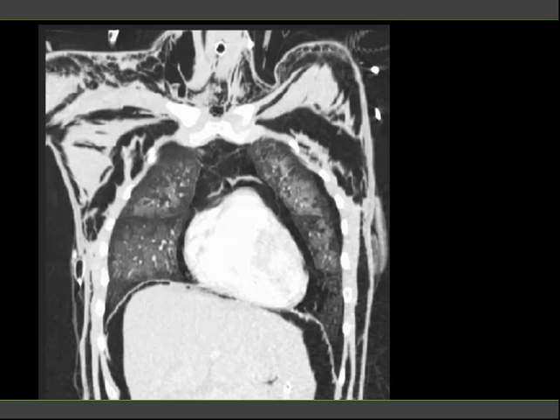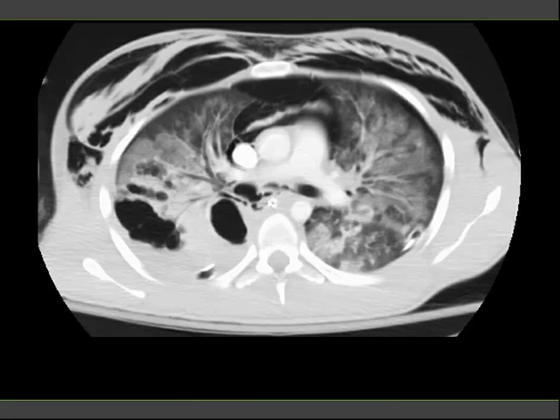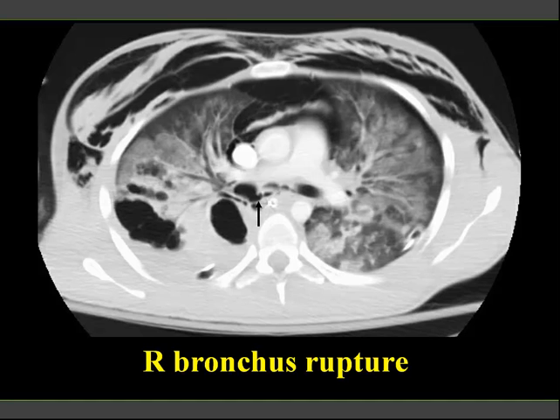And here you can see this very dramatic CT scan showing pneumoperitoneum, pneumopericardium, pneumomediastinum, and severe barotrauma to the lungs. The patient underwent detailed imaging showing the rupture within the bronchial system with air dissecting within the mediastinum and the rest of the patient's body. This could be repaired through endoscopy, and the outcome was very good in this patient. CT is essential in a case like this.